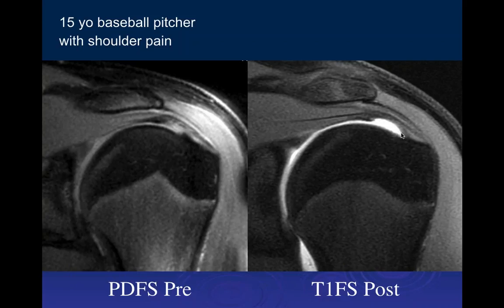So the significance of this would be very questionable. It's certainly not a surgical lesion. Whether it's associated with symptoms or not is something that's very debated right now. So it shows that there is some pathology here, but I think it's reasonable to call this a tendinosis because it really shouldn't lead to any change in treatment. So the arthrography shows it a little bit better, but I don't think that change in diagnosis would change the management of the patient.